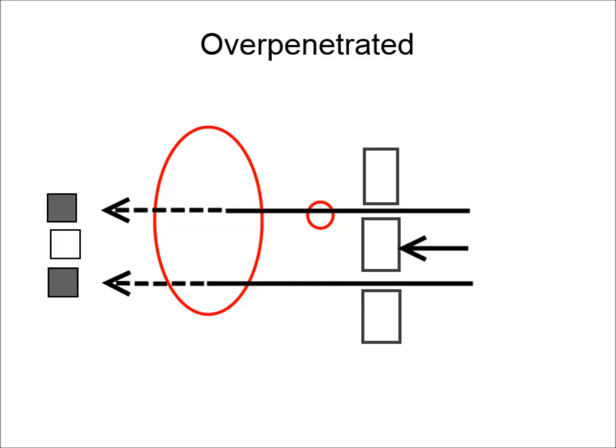In an over-penetrated film, the powerful X-rays go straight through the small, soft pulmonary vessels as if they weren't even there, making them invisible, while the heart appears darker than it should.